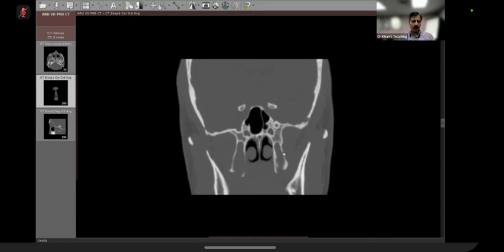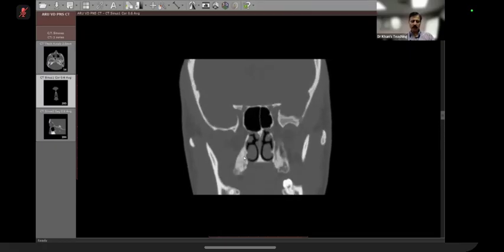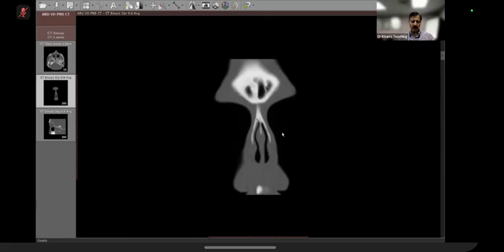So remember, Le Fort injury is Le Fort 1, 2, and 3, and I'll show you cases. And in each of them, one of the prerequisites is that the pterygoid has to be fractured, either unilateral or bilateral. So these are the pterygoid plates of the sphenoid. Now, forget about the facial bones, and let's concentrate on the paranasal sinuses.